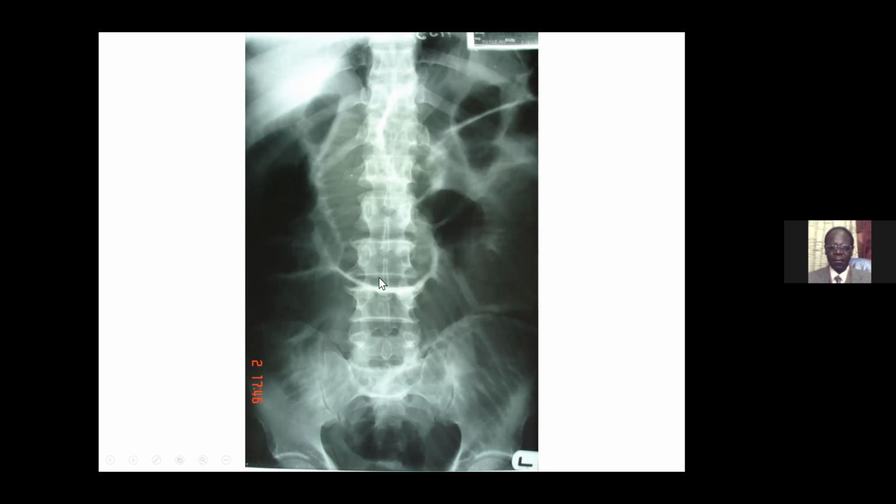So to know whether there's intestinal obstruction, we need to take a decubitus view, which is the next image. And the patient is lying supine, and the X-ray beam is horizontal from the X-ray tube on one side, and the image receptacle, the cassette, is on the left-hand side.